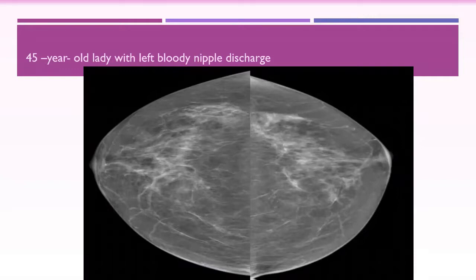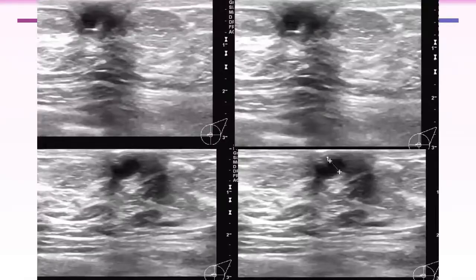So how do we manage? We go for ultrasound. This is the ultrasound. It shows a dilated duct, a short, mildly dilated duct. I cannot see the rest. Is it echo-free? No, it's not echo-free. There is some internal echo. So complicated ducts. So what is next?